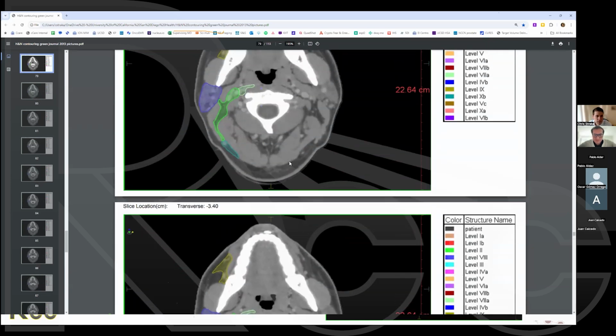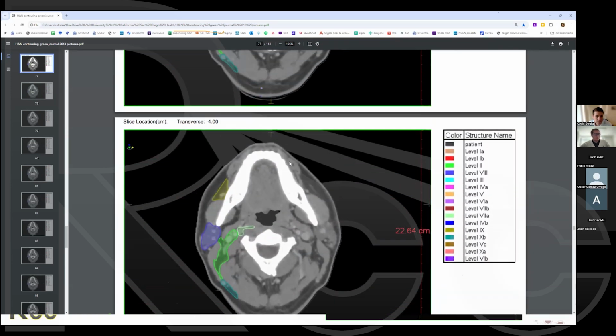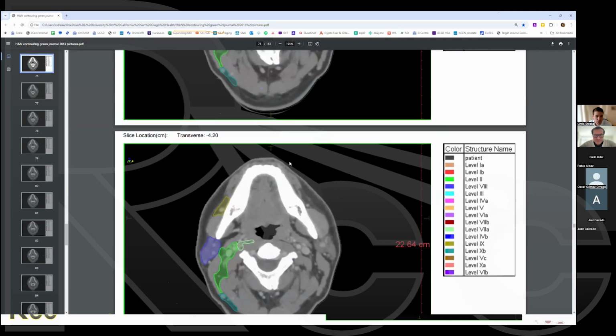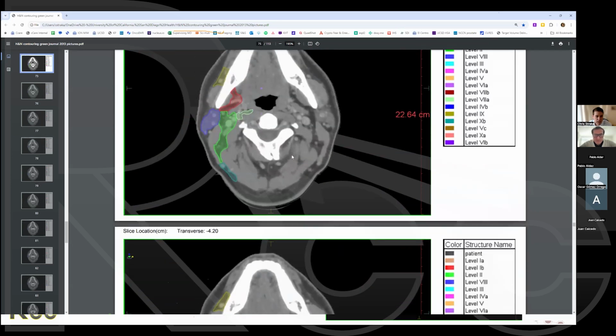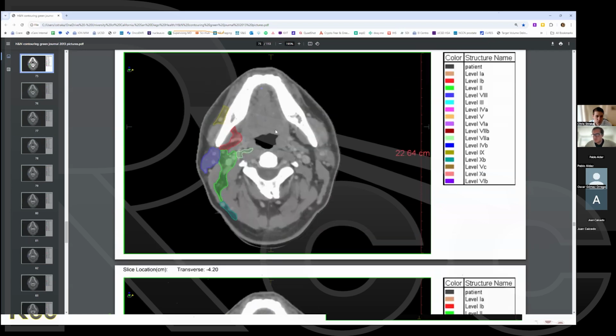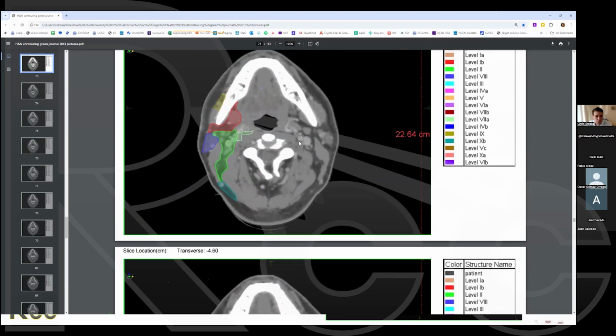So these do go, 7A does go lower as we get down here. Again, this is all just opportunity to, if you are confident that it doesn't need to be included, purposely exclude. Otherwise, in the vast majority of cases, you're sort of just contouring all of this as level 2. It's typically the way we end up thinking of it, but again, formally it's different.